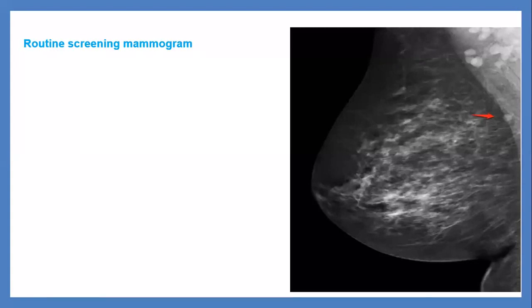What is your impression about these lesions? And I give it BI-RADS 3. The nodule projecting over the pectoralis, and importantly, you can see the pectoralis through it, and you describe it well. It is iso, or equal, or relatively low, and you can see the pectoralis through it.